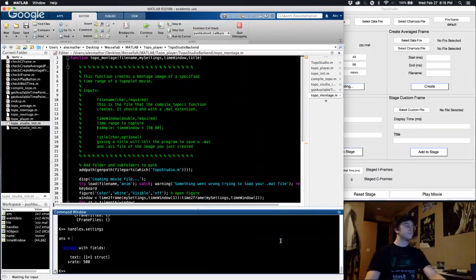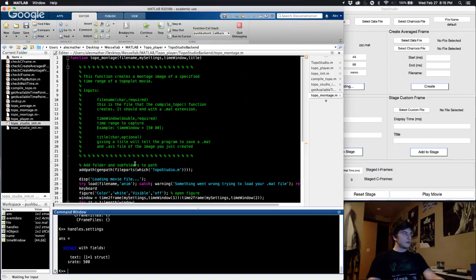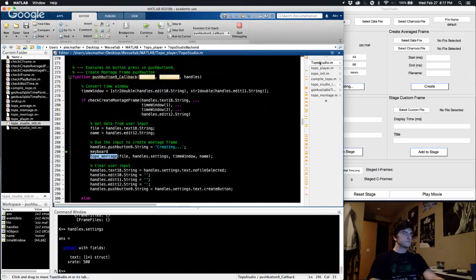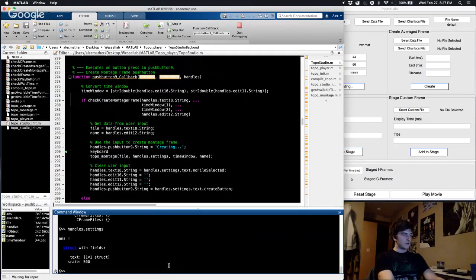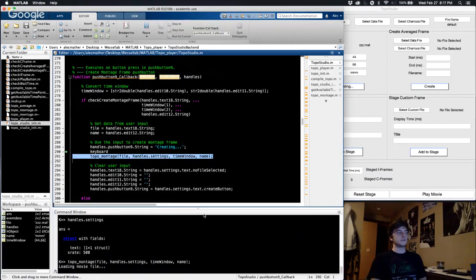I don't know. Let's try it. We'll keyboard into here. We've got our sample rate. We can always just pass in only the sample rate, that's the only thing we need, but we might as well try it. I'd like to be able to pass in an entire settings struct, but I don't know why that wouldn't work.